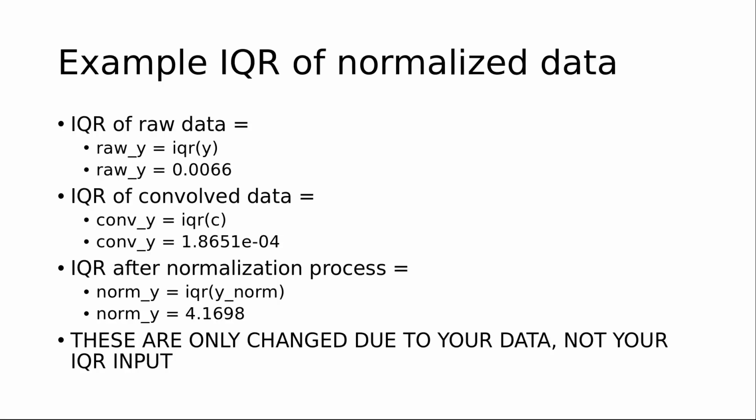And the outputs being the actual values. So you'll see that they change throughout that. And these only change based on your data. If you change the IQR variable, it's not going to change these values. So you don't really have control over this.